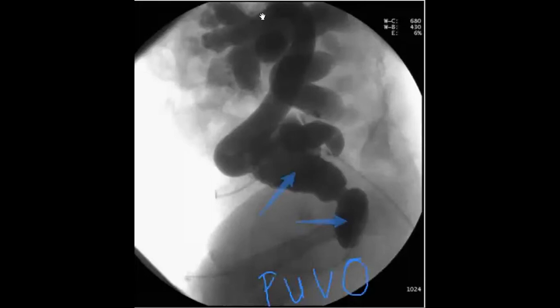And I see that Nermeen, Ala and Huda, everyone is agreeing with me that there is bilateral hydronephrosis. Perfect. So bilateral vesico-ureteric reflux, hydronephrosis, and dilated tortuous ureters, and it even reached the level of the calyces. So you mention that it could be a grade 5 reflux.